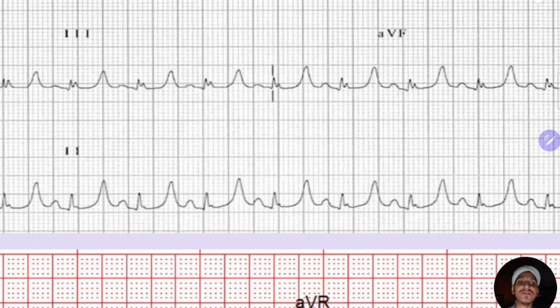See, there is P wave. The PR interval from here to here, if you take, 1, 2, 3, it is normal. The PR interval is normal. The P wave is also there. So it is an early hyperkalemia. Maybe mild to moderate hyperkalemia, you can say more than 6.5 milliequivalents, 6.5 to 7. This may be the range of hyperkalemia in this patient.